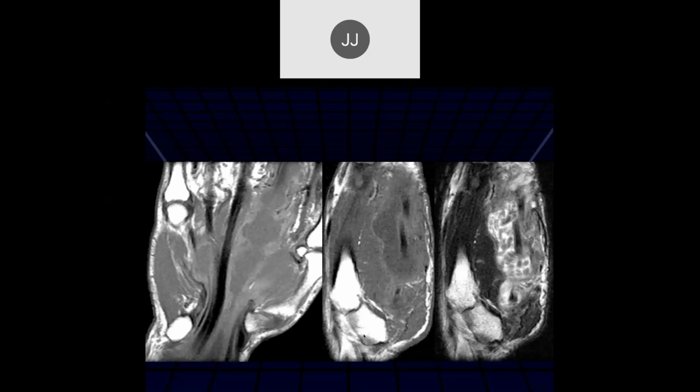All right. So we're looking at the flexor compartment here. It looks like a lot of synovial thickening and fluid and a bunch of debris inside the flexor tendon. So what's kind of your thought here? Some sort of inflammatory arthropathy. And then it looks like you've got little rice bodies here, or something similar to rice bodies. So a number of things to think about.